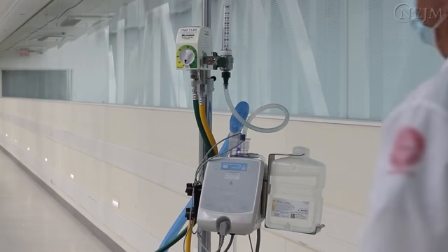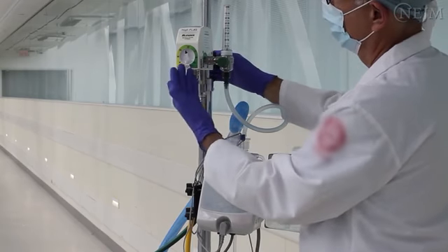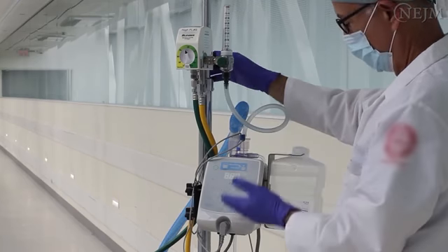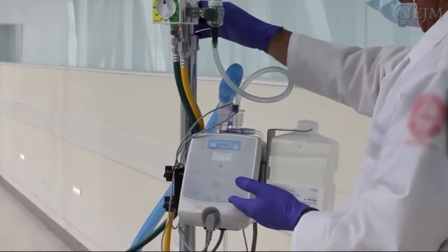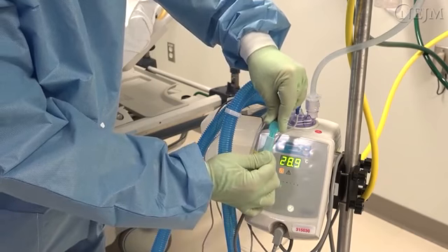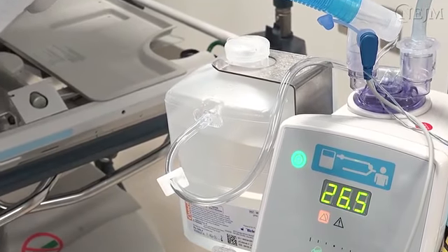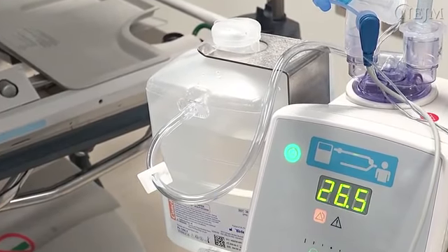There is a breathing circuit that consists of an air-oxygen blender, which is used to adjust the oxygen concentration, and a flow meter, which is used to adjust the flow. There is also a heated humidifier that continuously monitors the airway temperature and regulates the heating element. A sealed heated wire within the circuit may be used to minimize condensation within the tubing. Sterile water is supplied in a pre-filled disposable reservoir. Water flows from the reservoir into the humidification cartridge, where it is vaporized.